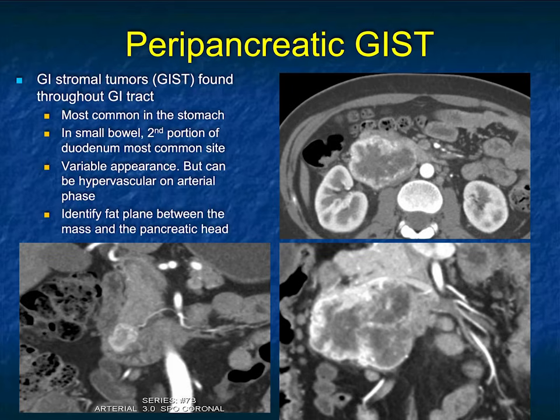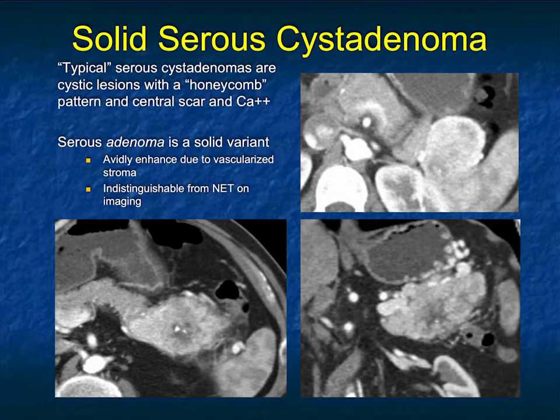The bottom left, I would have thought about a neuroendocrine tumor. That's a good possibility. Again, could this be a carcinoid? Could this be metastasis? So again, there's a lot of overlap. At times, the diagnosis is going to be made by biopsy, but I think as radiologists, we need to try to really think about the possibilities and again, make sure the patient is managed correctly.